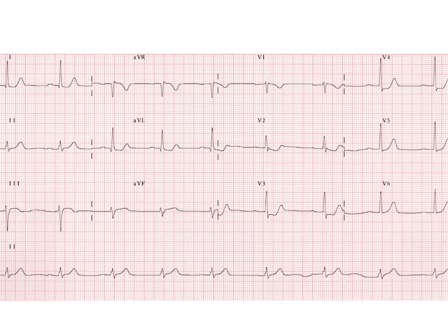So here's another one. I'll let you kind of look and tell me what you think is going on with it. If there is anything wrong, this could be completely normal. So you have 10 seconds to look at it because that's as much time as you'll get in the real world. All right, time's up. That wasn't 10 seconds, but that's okay.